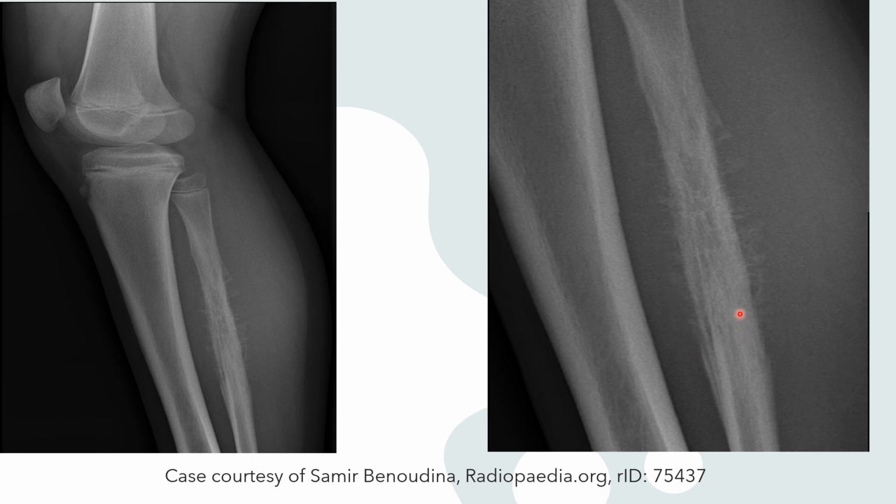You can see that the bone in the mid is a bit lytic or moth-eaten or permeative. Outside you can see that there are some layerings which represent an onion skin. And over here we have these perpendicular hair-like extensions or spiculations which represent sun rays going perpendicular to the bone. Now these two things represent an aggressive periosteal reaction.